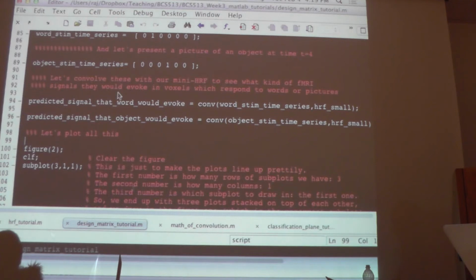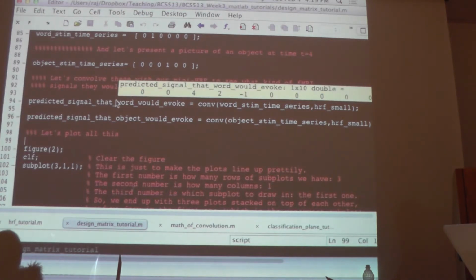So that's a vector, and the jargon term for this is a row vector, because it's a row. By tradition, the way you make a design matrix is that we join these together as columns instead of as rows. So we're going to flip this row and turn it into a column vector.